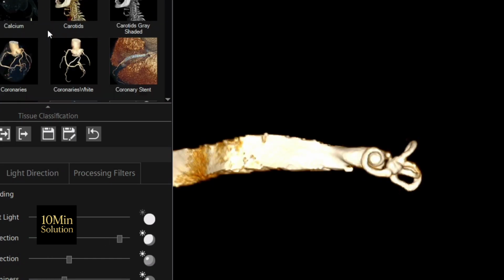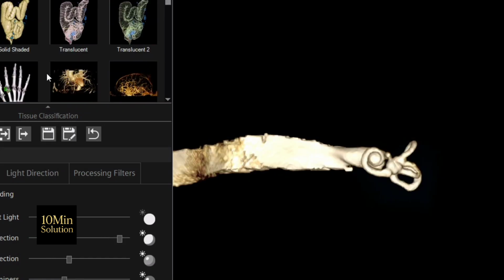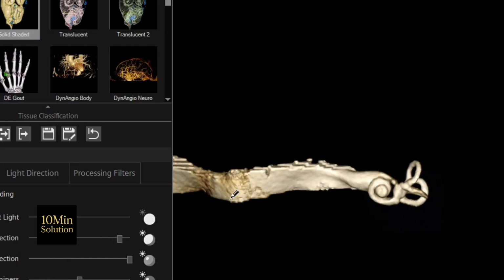Conclusion. This was a complete overview of the MRI of cochlea post-processing system.